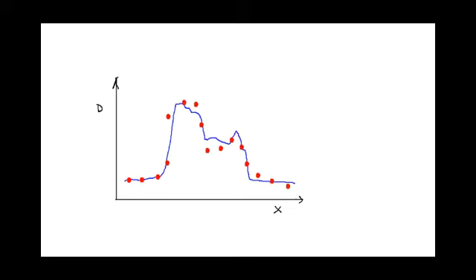The problem here is that if you look at a particular point, it can actually be quite distant from the measured dose, even though you can see that it actually isn't deviating that much. It's just that it's in a high gradient region, but it's close to the planned dose in this region. So you need some way of accounting for this and analyzing it.